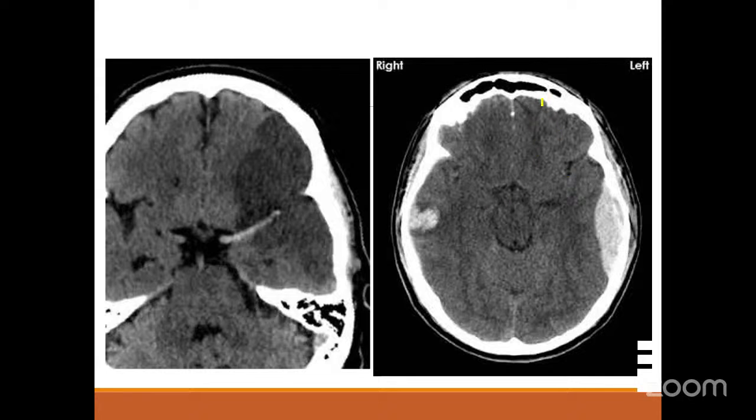So the brain parenchyma or the frontal lobe tries to herniate onto the opposite side under its partition, that is the falx cerebri. Then we call it a subfalcine herniation. Or if there are deep bleeds, say thalamic bleeds or basal ganglia hypertensive bleeds, if the edema is increasing or the bleeding size is increasing, it will try to push the brain to herniate down under the tentorium. That is called a transtentorial herniation.